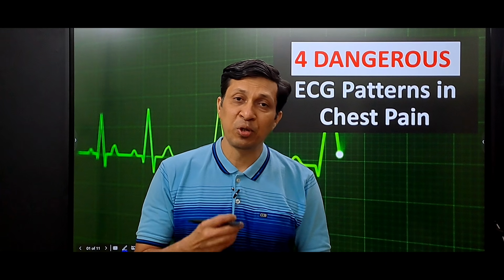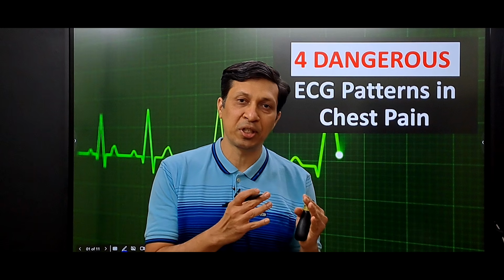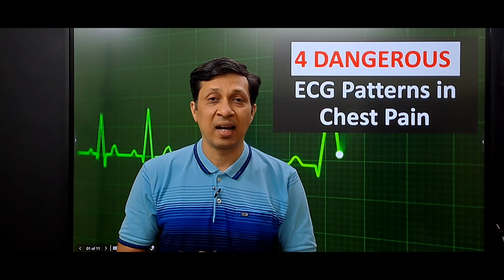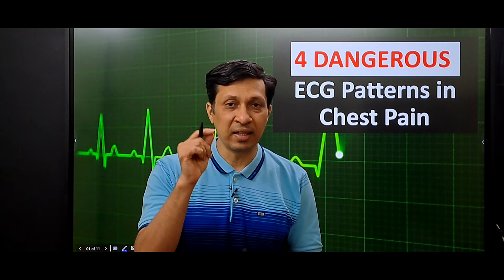A patient comes to you with chest pain and you have only a few minutes to decide whether to admit this patient or to discharge. The answer lies in the patient's ECG, only if you know what to see in that ECG.